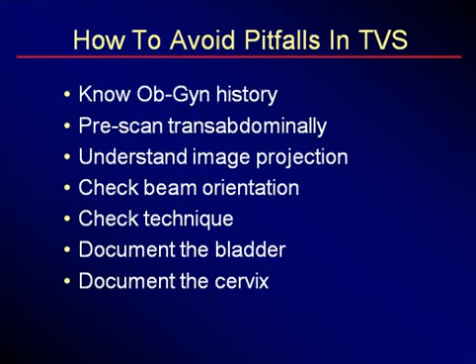So basically, think about how you do a transvaginal scan. You start from the beginning with the history, so to avoid the pitfalls, you want to know the correct OBGYN history. You do want to start with the transabdominal pre-scan. Then once you're doing the transvaginal, you want to understand your image projection. Make sure that you have the correct beam orientation. Check your different points of technique.